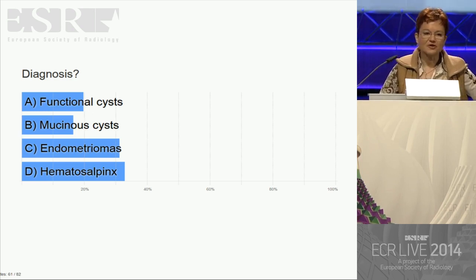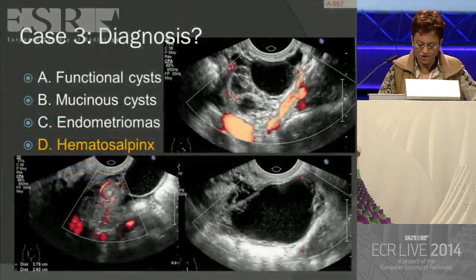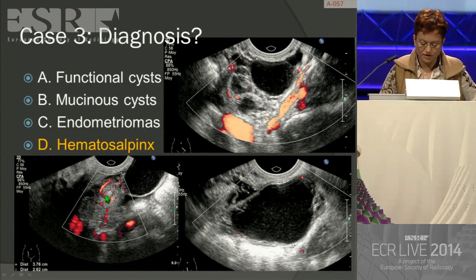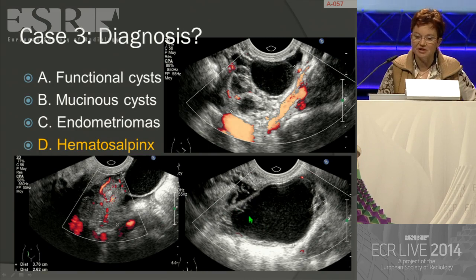So why couldn't those be endometriomas? Let's check where the ovaries are. I told you that both pathologies are similar. Now here you can see an ovary. This is a vascularized structure. Here you have a nice ovary. Maybe there is a functional hemorrhagic cyst, but the problem are those structures here on both sides, which are blood fluid. And the thing is, you can see this small incomplete septation.